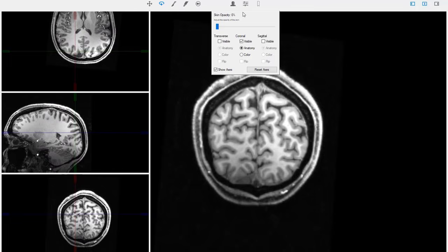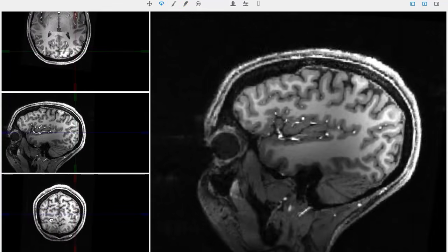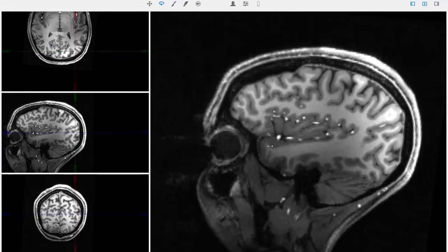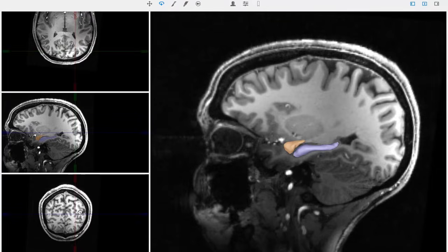Now let's look at it in a sagittal section. This is a parasagittal section. This is the hippocampus here, inferior horn of the lateral ventricle. This is amygdala up here. So hippocampus in purple, amygdala in orange. And those amygdala and hippocampus are in the temporal lobe. So here you're seeing temporal lobe, and as we slide in, you'll pick them up, amygdala and hippocampus.